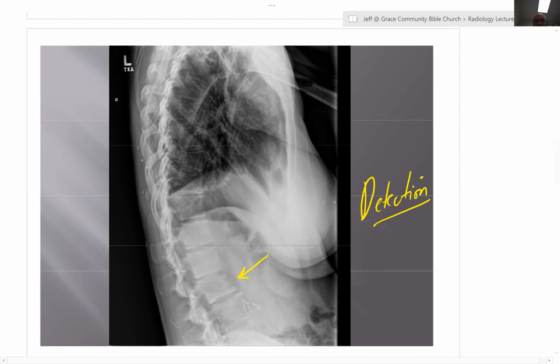Now, if I tell you here, look at this. There are surgical clips superimposed on the upper lumbar spine. So what organ probably was involved then if it's superimposed on the spine? Retroperitoneal. Kidney. Yeah, kidney. So let's put this together. They have kidney cancer. They had the kidney removed, and it has gone mets to the spine, affecting a couple levels, and the patient had no idea that they had metastatic disease. They just had back pain.